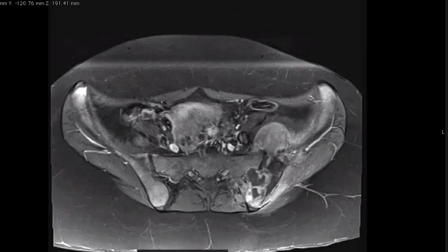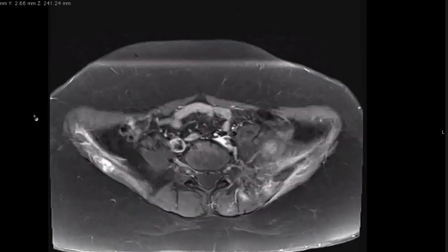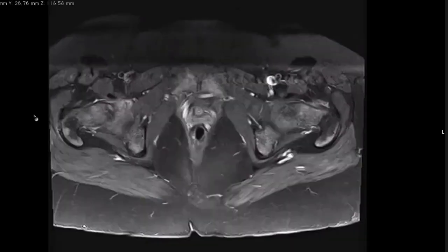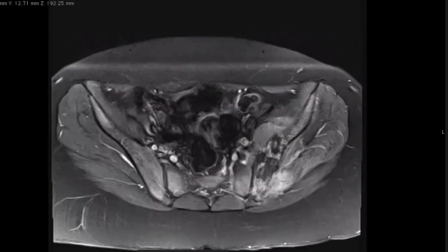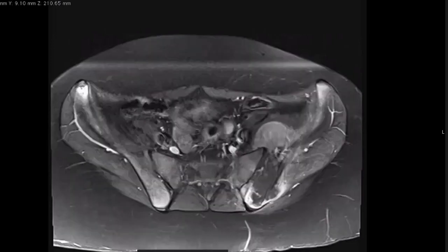You can do whole body MR. You can just do coronal T1 and coronal STIR. Most tumor centers across the world are moving towards whole body MR. Or in some centers they do even PET-CT, which carries radiation. But I think the general consensus is that you do whole body MR if you see Ewing's or osteosarcoma or any aggressive bone tumor. All right? Yes. Okay, good, excellent.